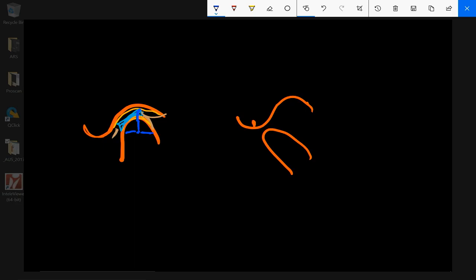So now we're in the open mouth view. What happens? We've translated, we've glided, and our meniscus is now straddling the tip of the condyle. I prefer to see no less than 50% of this bow tie behind the 12 o'clock position of the condyle. So if it's 60%, that's okay. 50%, that's okay.